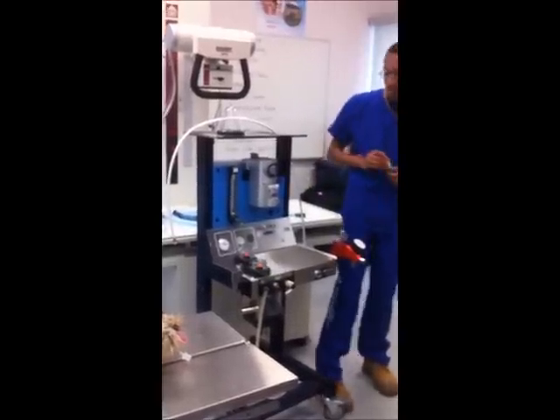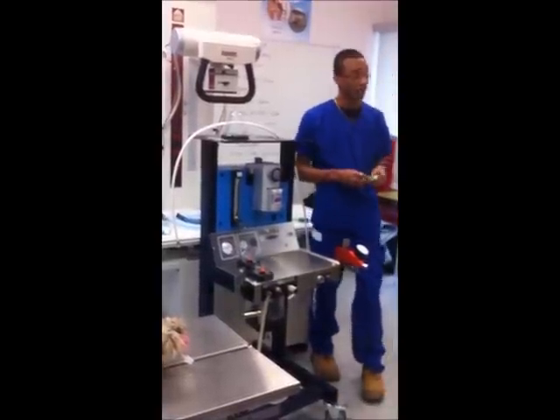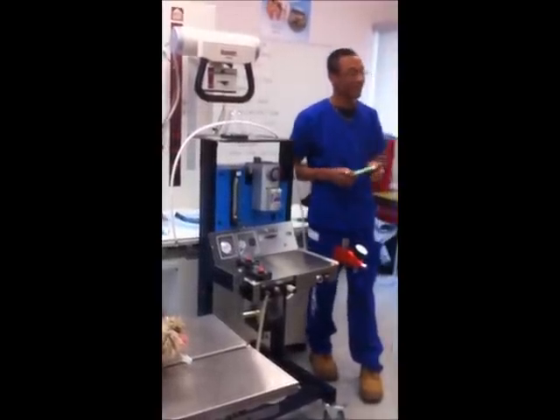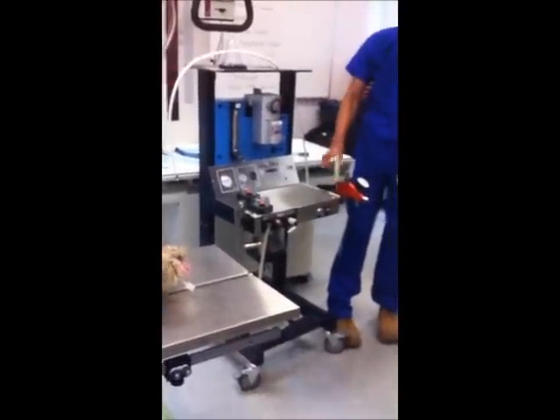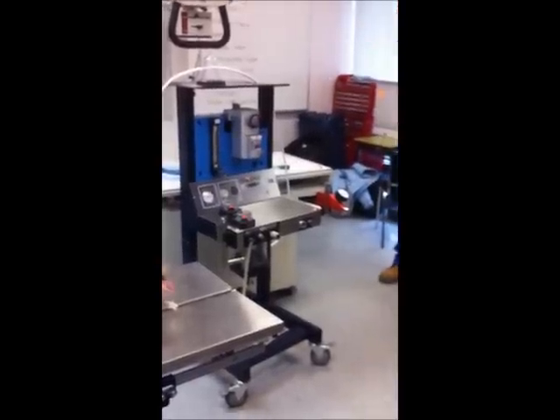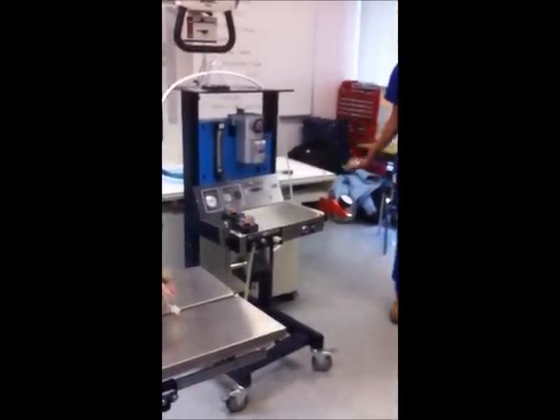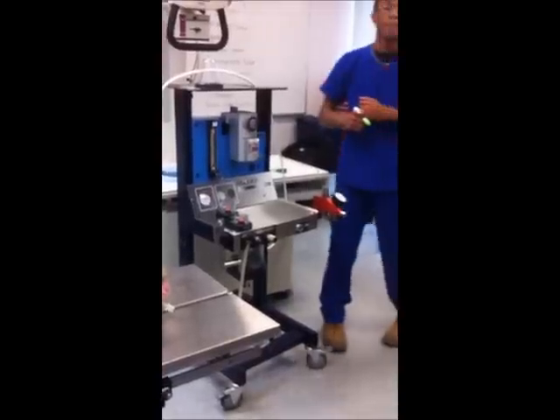And what is the next stop after your vaporizer? It's the last stop in the basic flow before it branches out. Fresh gas inlet. Good. This is your fresh gas inlet here. And this is where your basic flow ends. This flow is the same whether you have to set up the rebreathing system or the non-rebreathing system.